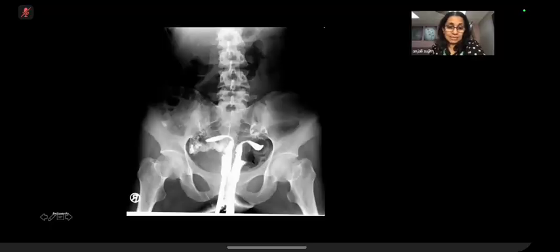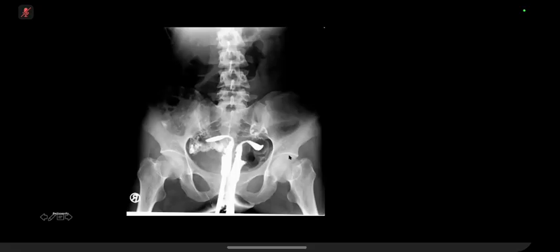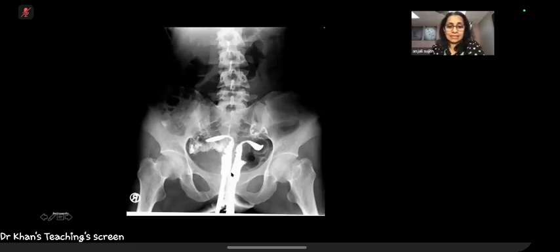So what is this diagnosis? This will be a didelphic uterus because there are two separate cervical canals and two separate uterine cavities and fallopian tubes. Correct. So you've been separately cannulated, two separate uterine cavities, not communicating. So this is uterus didelphys.